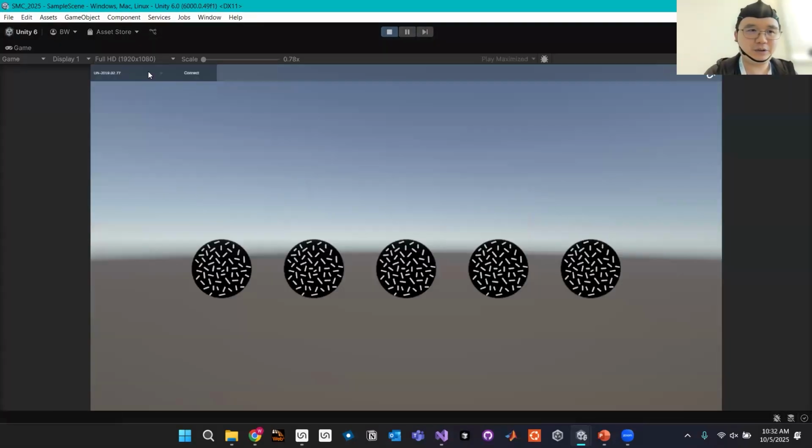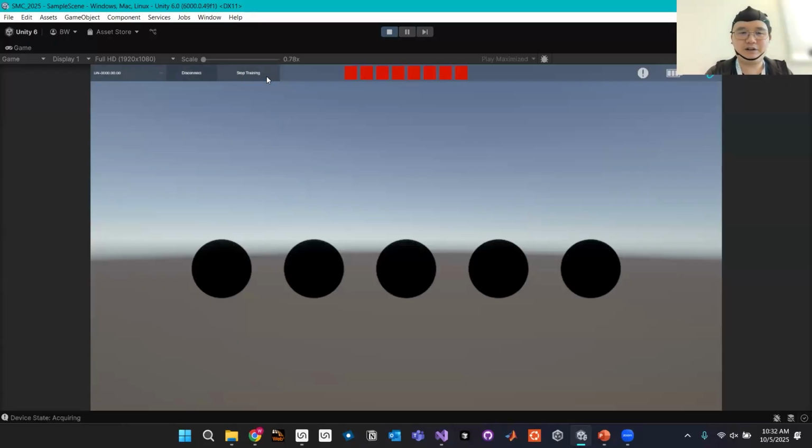It will still take a bit of time to load. I mean, at the end, I will use the Unicorn to show you the final product, but at the moment, I just want to quickly demonstrate. 1, 2, 3, 4, 5, 6, 7. So we need around 20s. 9, 10, 11. Around this time, then I try to stop.